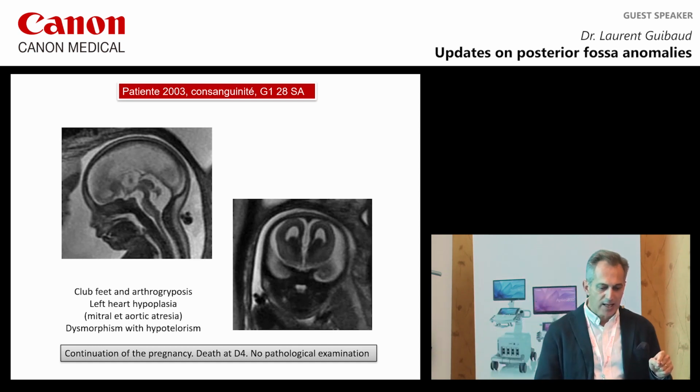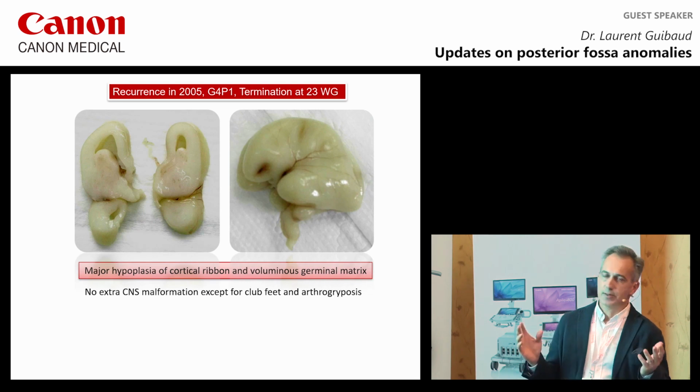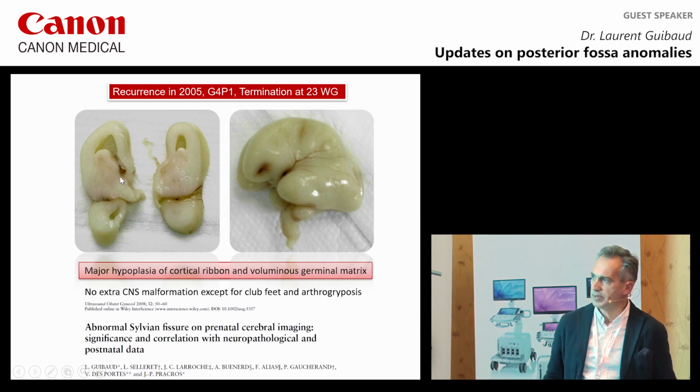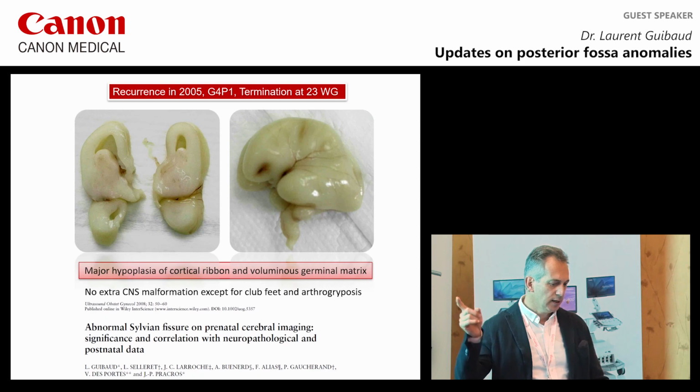But the patient had a recurrence in 2005, and it's the same thing, with large germinal matrix here.